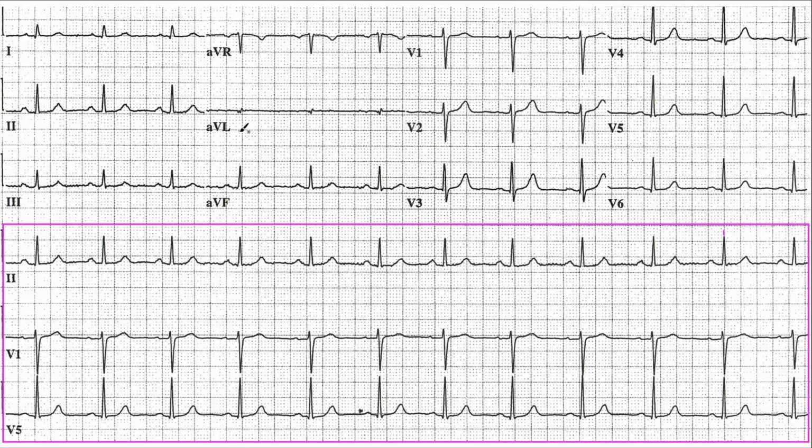Getting to the 12 lead. Oh, okay, here we go. This is jumping out at me right away. Lead AVL is low voltage. Okay, that could be a mechanical issue. If it's not, then we have a problem. What else do we have here? QRS is upright, QRS is upright, QRS is upright, right? QRS is upright. This is normal axis deviation.